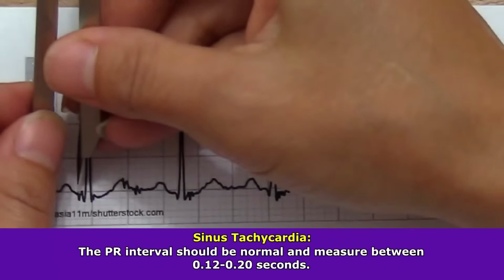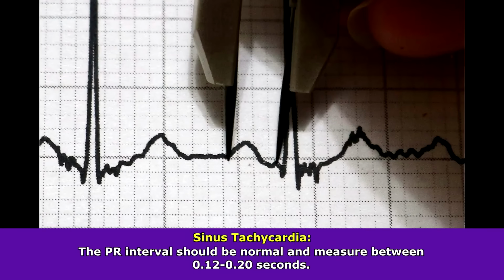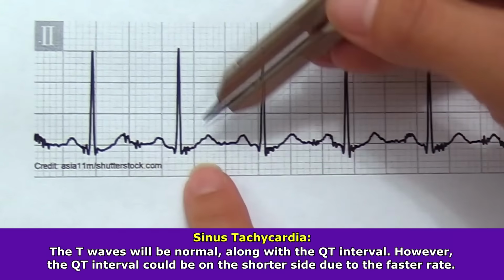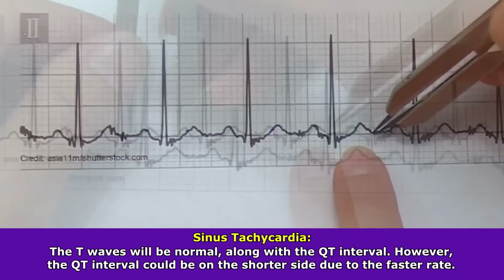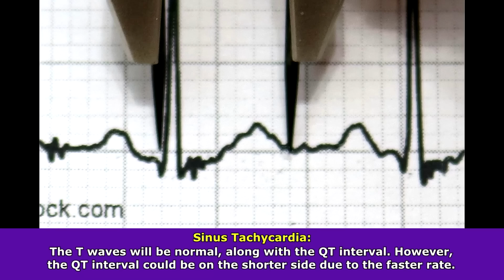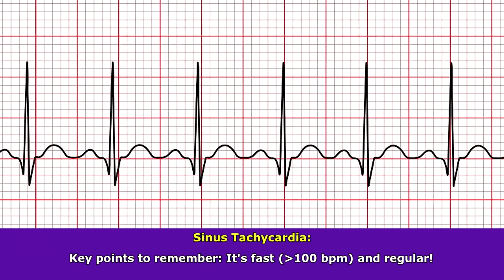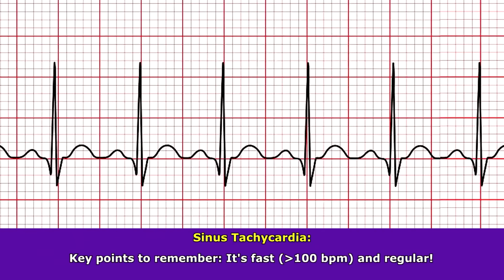Furthermore, the PR interval should be normal, anywhere between 0.12 seconds to 0.20 seconds, and the T wave will be normal along with the QT interval. But it could be on the shorter side, that QT interval, because the rate is fast. The faster the rate, the little bit shorter it's going to be. But overall, the big takeaway with this rhythm is that it's going to be fast, greater than 100 beats per minute, and it's going to be regular.